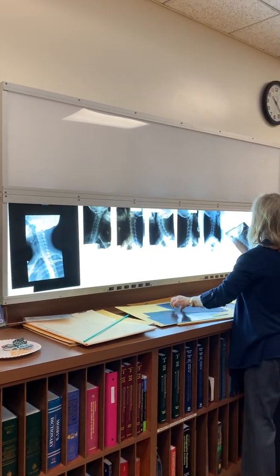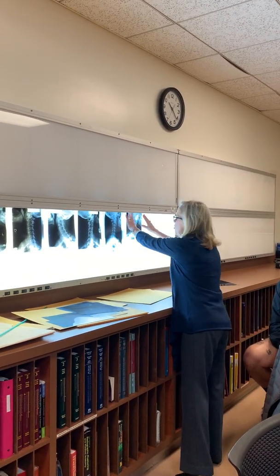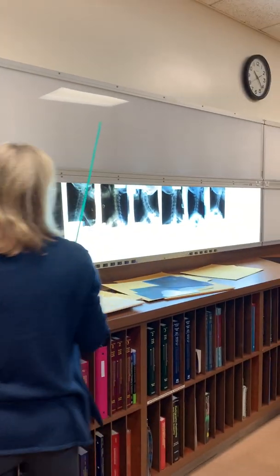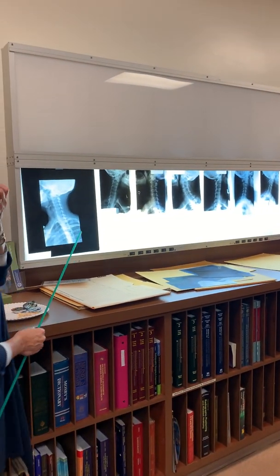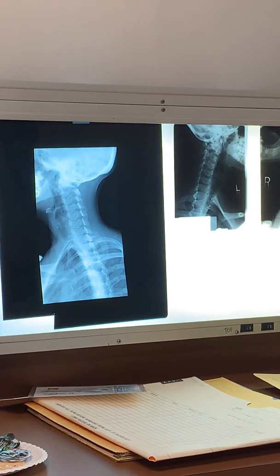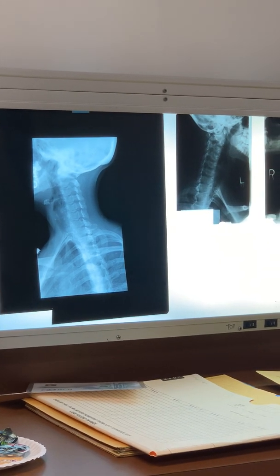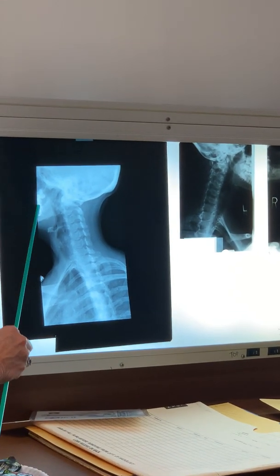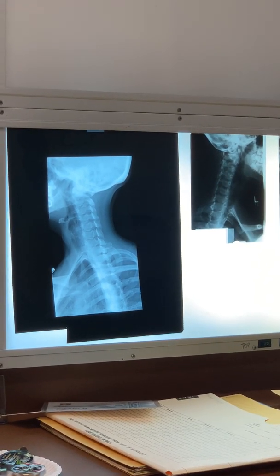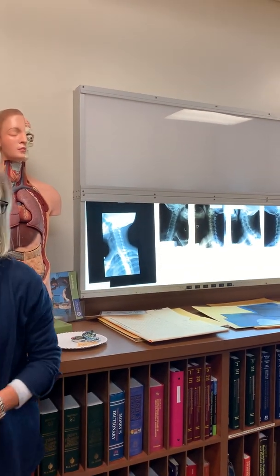You don't really see swimmers views on cervicals, right? No. Okay, mainly lumbar. All right, so these are obliques, or what's supposed to be obliques. And like Masako said, we should see the intervertebral foramen on which side? Remote side. Remote means the side furthest away. So what position, here's the right marker, so what position is that? It's an RPO. Just look at the way that the face is facing.